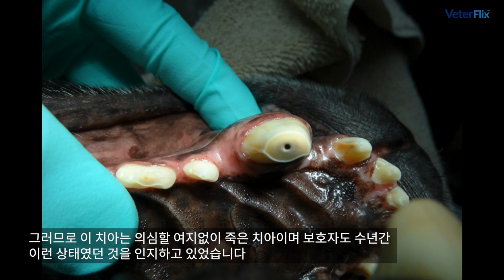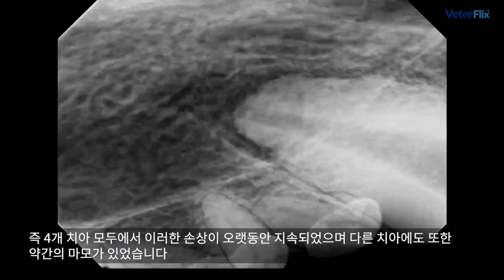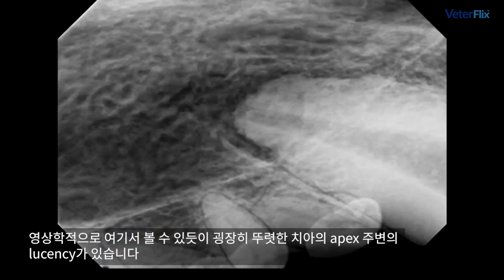The owner had recognized that this had been going on for many years, so this is a long-standing defect on all four canines, and certainly some other wear on the other teeth as well. But radiographically, what we see here again is a very distinct lucency surrounding the apex of this tooth.